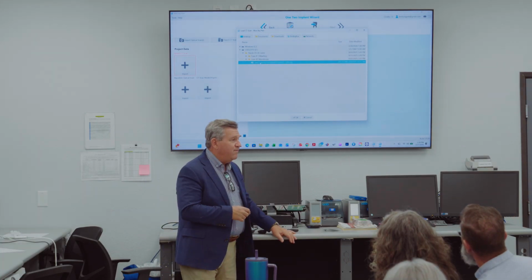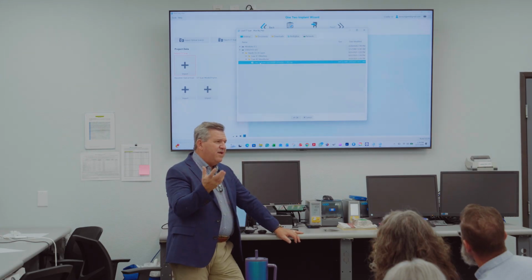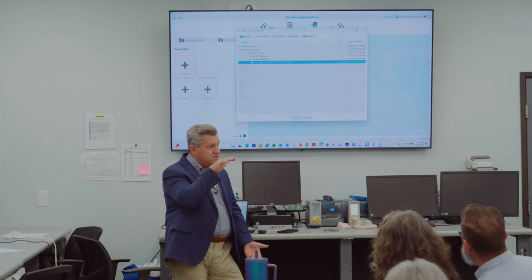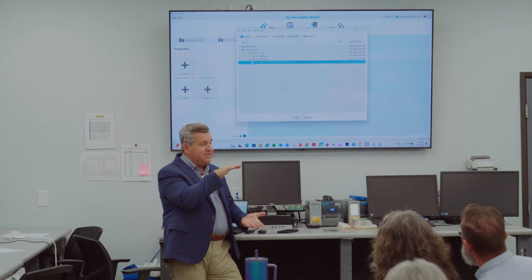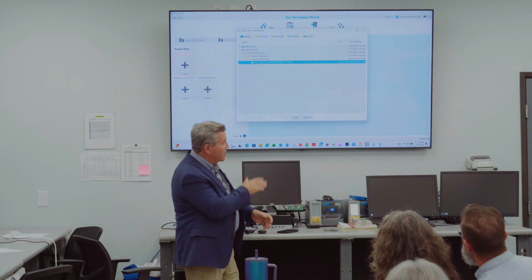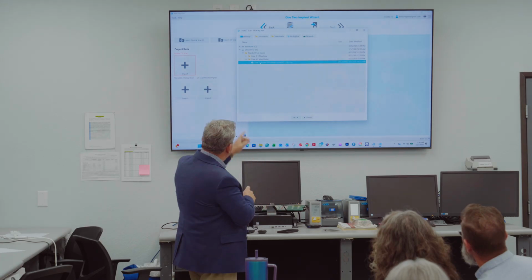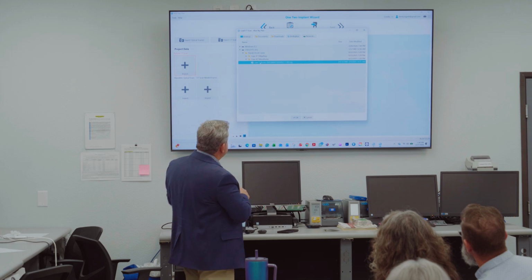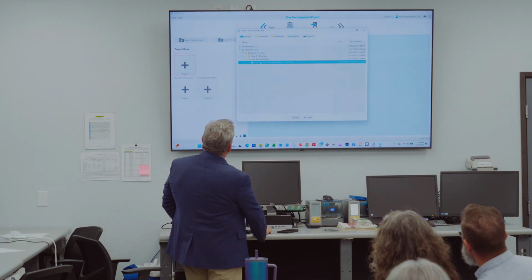So if you get a CBCT, does everybody have their own CBCT? Or are you paying to have it done? Okay. Either way, you could be getting files with a bunch of slices in it. If they're individual slices, like hundreds of files, you need to zip them up, because the software only looks for zip files. So it's going to come to this zip file that we're choosing in mandibular case number 2. Just highlight it and click OK.